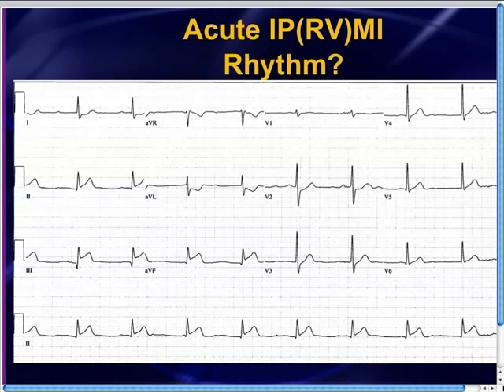I've got to tell you the other reason that you question whether those are really P waves: you think about what the money leads are. The money leads are lead V1 and lead 2 for picking up P waves. If you ever want to know whether there's P waves, the first things that you look at are lead V1 and lead 2. V1's not much help here. I don't really see any good P waves in there.